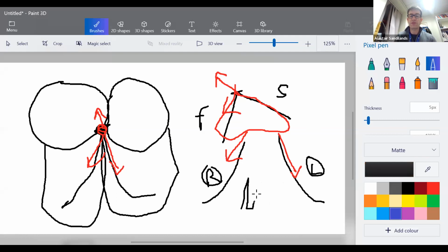So you have a regular rhythm and a very narrow QRS, which all the heights look the same. And you don't tend to see any P waves. So the heights of the QRS should be the same. They all look the same. And this is an example of a narrow complex tachycardia, or in actual fact, this is called atrioventricular nodal reentrant tachycardia, because this is the node. AV nodal reentrant tachycardia, AVNRT.